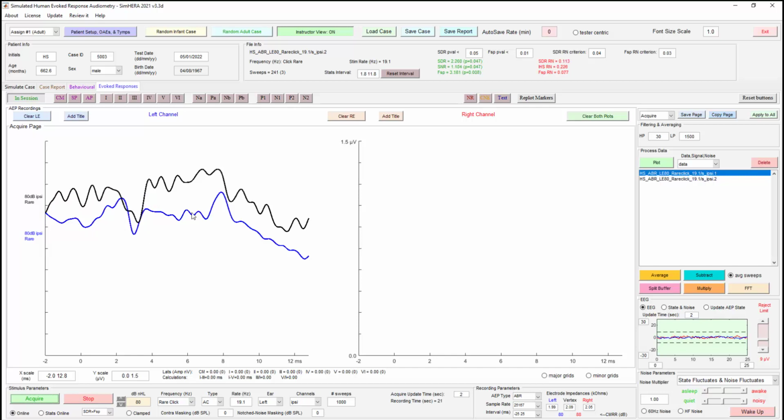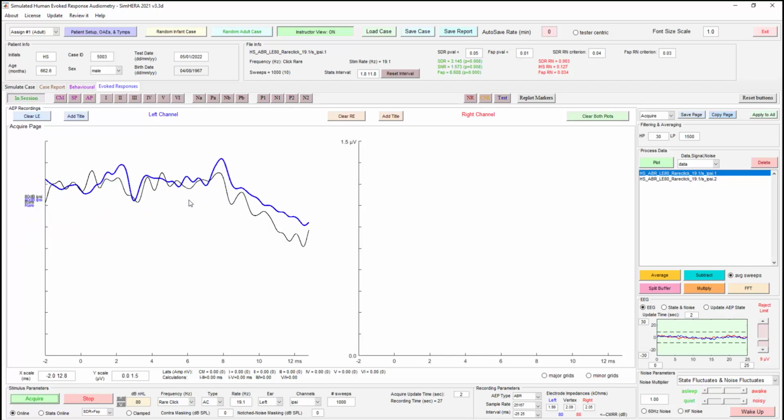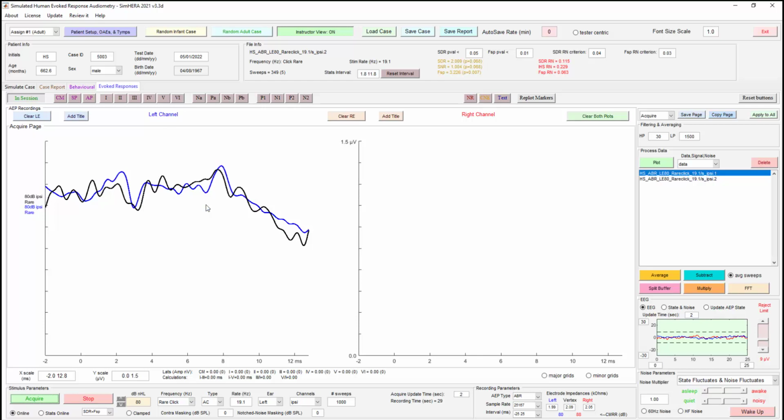That will hang your computer. And I've got a fairly fast graphics card on this computer, so the graphics card can handle that, moving it around. But we have noted in the past on lower end graphics that clicking and dragging these things while the recording is ongoing can be problematic.